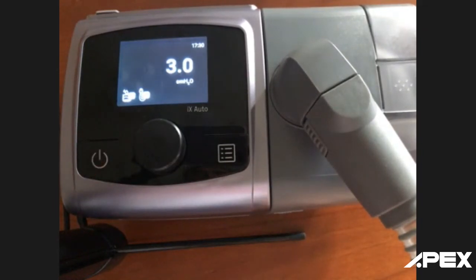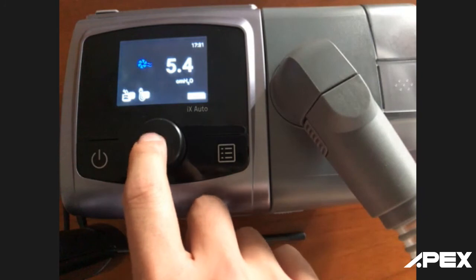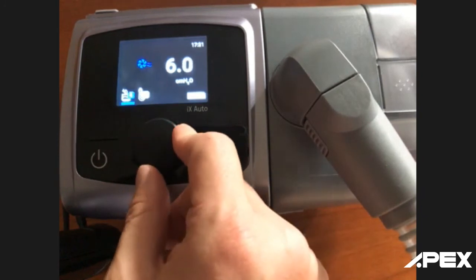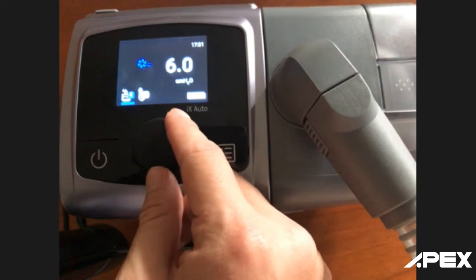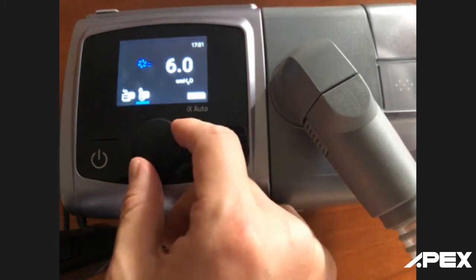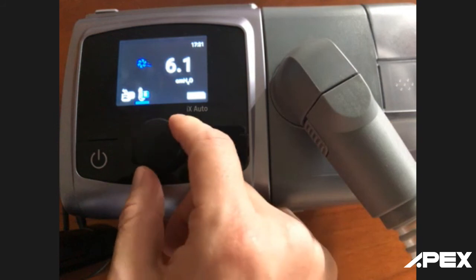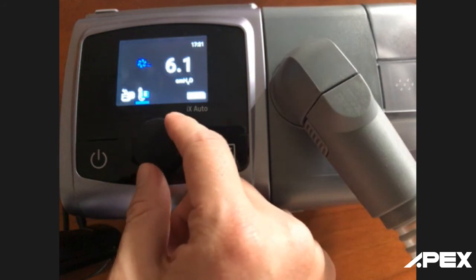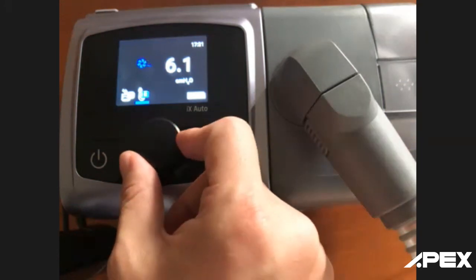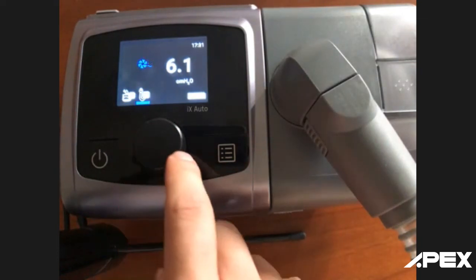So once I initiate the therapy pressure, it will start to give air. And then I can press my turning knob. Here is the same to adjust the different level of the heated humidifier. To confirm, press down. And then I can change to adjusting the different level of the heated tube. 0 is off, and to adjust 1, 2, 3, 4, and up to 6. And to confirm is to press the button till it reaches white.